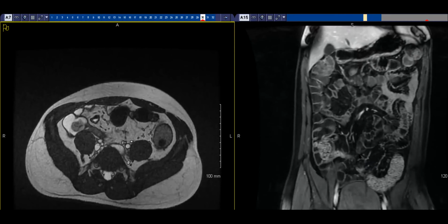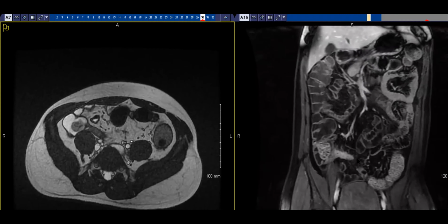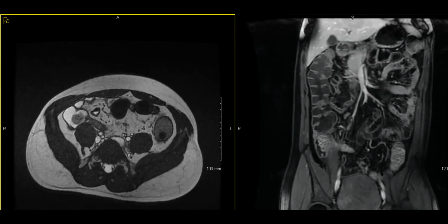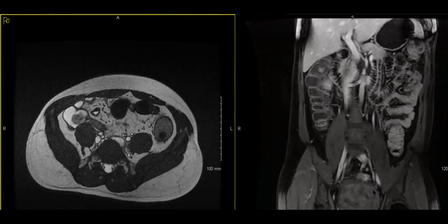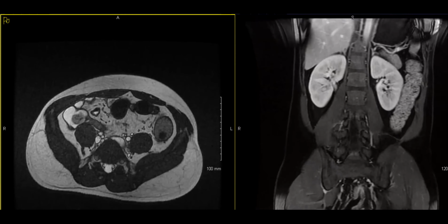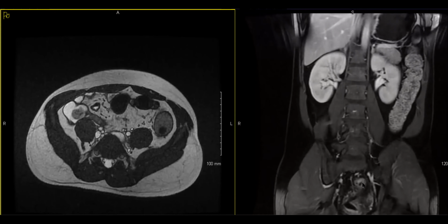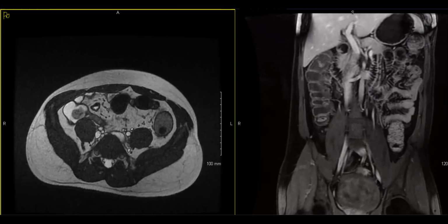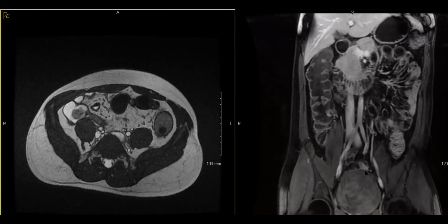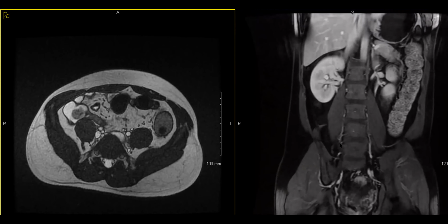But it can happen. And interestingly, it does happen in younger males more often. This guy is a young dude. I don't remember exactly the age. We thought maybe there's also some rectal involvement, and you can see it here. Probably he also has involvement of his rectum as well. So it's not truly an isolated Crohn's, I guess, because he does have another place that's involved. But that was pretty cool.